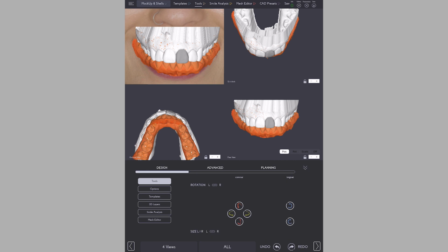For that reason, we are going to go to rotation and rotate the incisal edge inward. Notice now that the central incisor is less square because the cervical part was inside of the patient's cervical margin in the intraoral scan. And then over here on the right side, we can rotate it sideways, just like that. Okay?